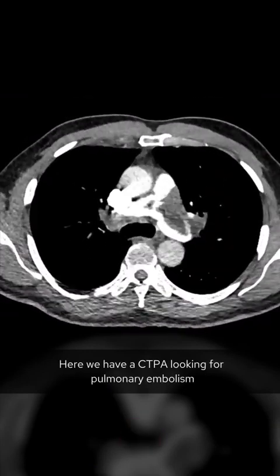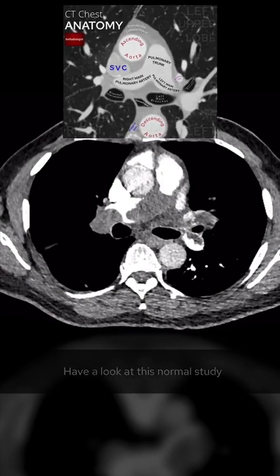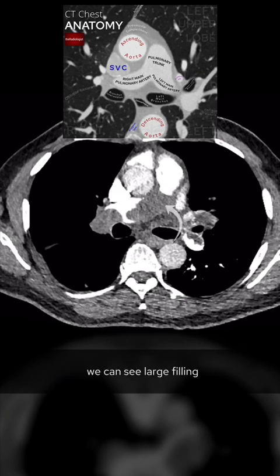Here we have a CTPA looking for pulmonary embolism, so we're looking for filling defects in the pulmonary arteries. Have a look at this normal study where we have the pulmonary trunk splitting off into right and left main pulmonary arteries. Here in our case, we can see large filling defects affecting all of these structures, highly suggesting pulmonary emboli. Once you see pulmonary emboli, don't stop there.